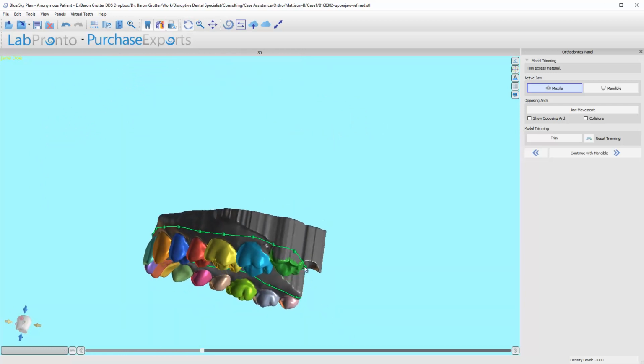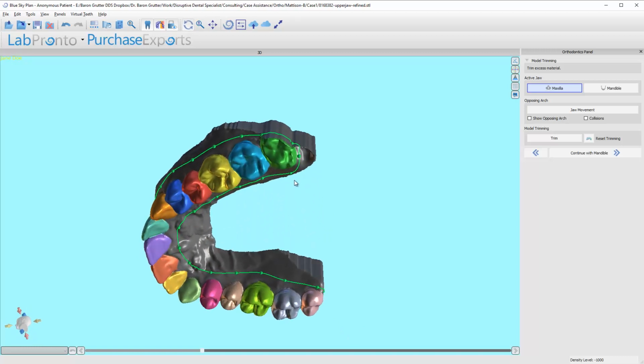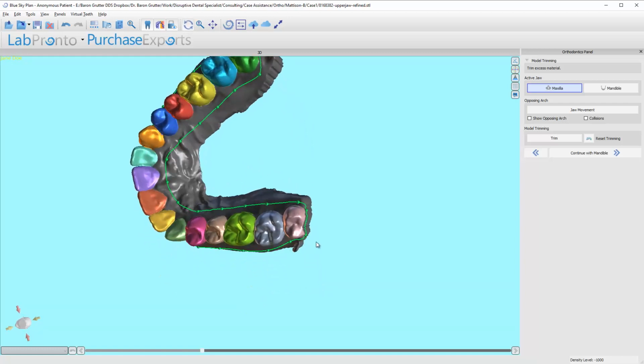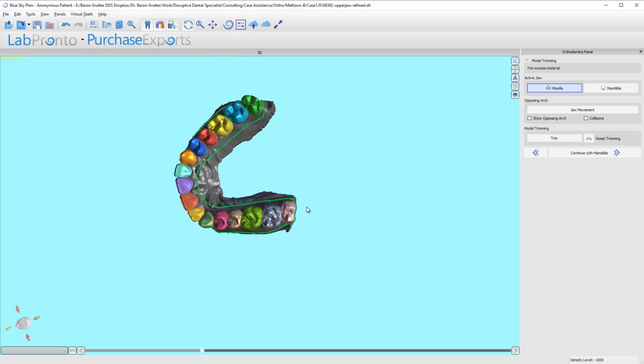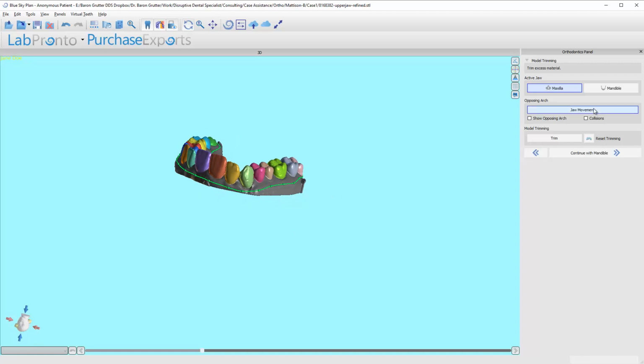And I do like to look down here and see if I can create sort of a flat heel on both sides, so that when I export these models or when I add a print platform for these models, I've got a flattish surface to align it to. It's going to be hard with this tooth, that's fine, but all right, I think we'll just manage with just a little bit more of that. All right, let's go to trim.